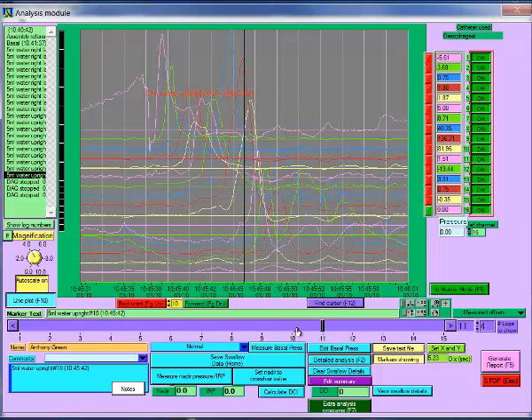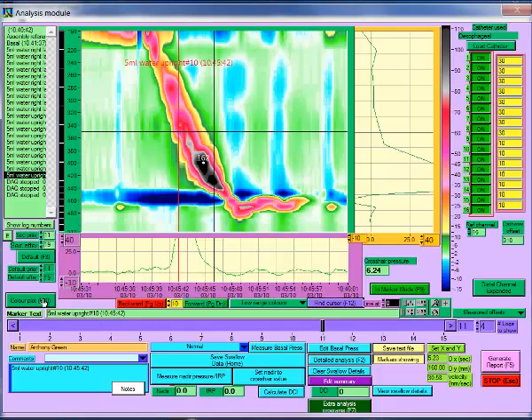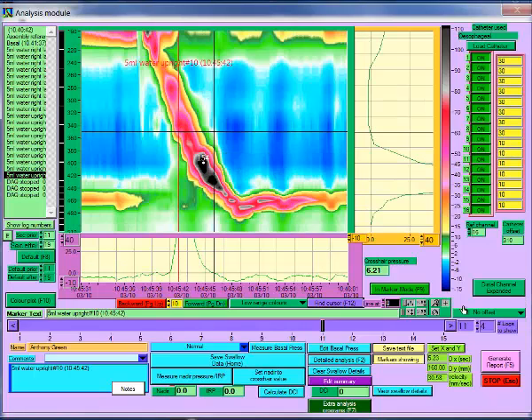You can return to the colour plot and view the change. Use the offsets control to determine whether these offsets are corrected or not. If you change the offset control to measured offsets without having defined these, you'll receive an error message.